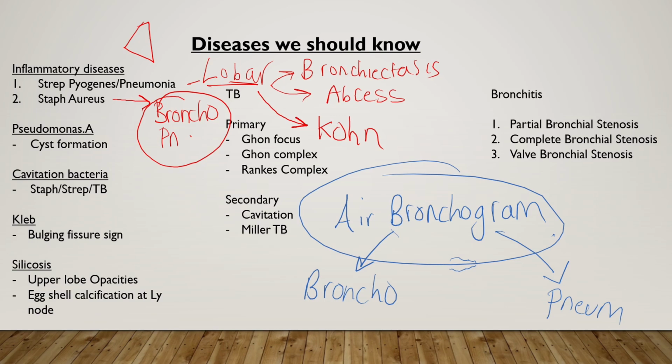That's how this spreads. Now, if we focus on staph, it causes bronchopneumonia. Bronchopneumonia is localized to the lower lobes, and bronchopneumonia is a more patchy disease of the lung. However, lobar is a more homogeneous, more radio-opaque disease.